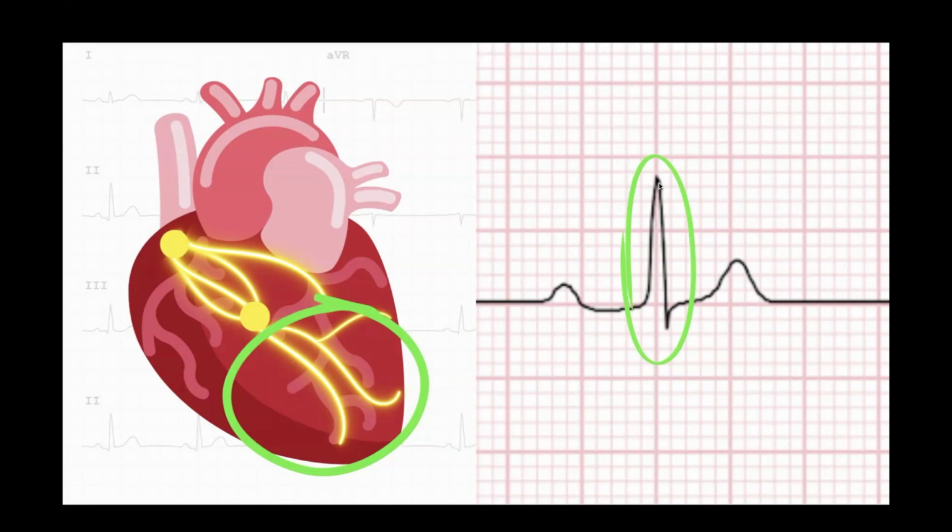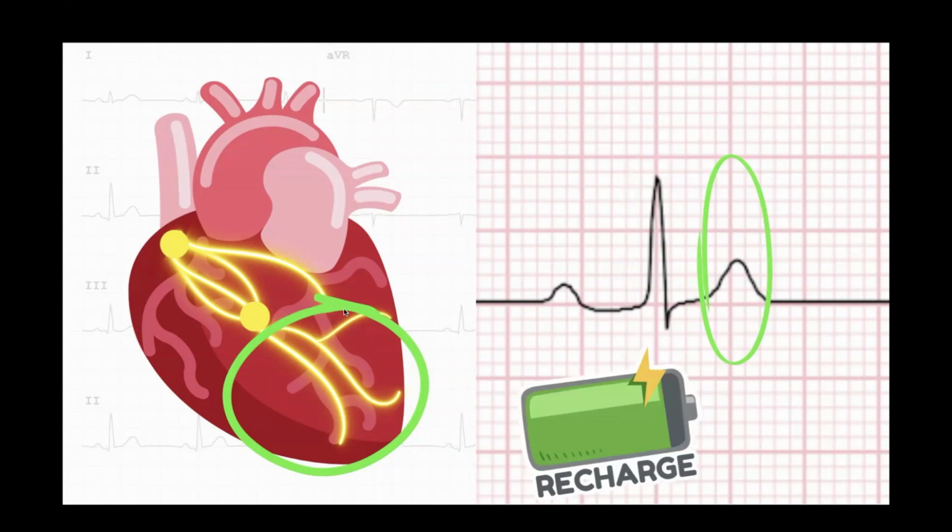Now this right here is the QRS. QRS depolarizes, and that's the ventricles, the electrical impulse causing depolarization. So that's a positive inflection. You want this narrow, less than 0.12 seconds or 3 little blocks. It tells you that you have good high velocity through that large surface area. After the ventricles depolarize, you need to recharge them, right? So then you get what is called the T wave. T wave is ventricular repolarization. You might ask yourself, well, why do we see ventricular depolarization and repolarization, but over here we only see atrial depolarization and we don't see atrial repolarization?